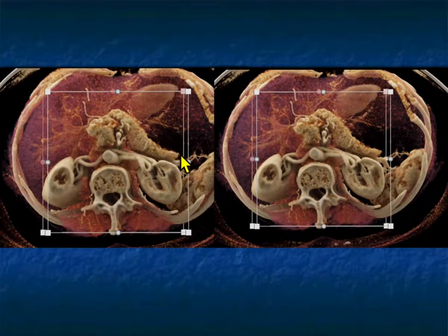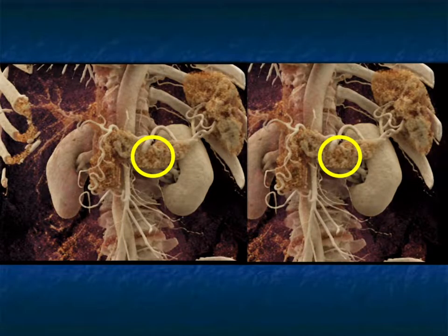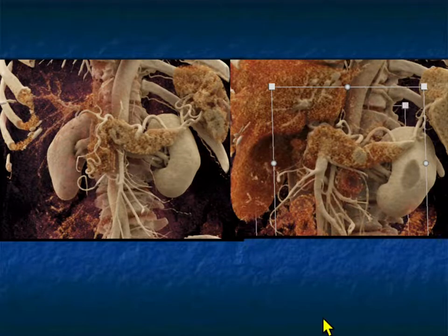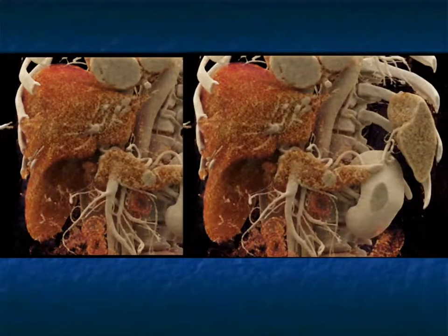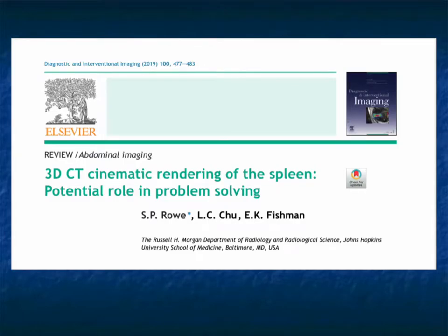At first glance, the pancreas on arterial phase looks pretty good, but then if you look a little bit more carefully, you see the textural change. And this is a good example of a case where the lesion is obvious on the cinematic, but was not seen even in retrospect on the arterial phase imaging. The textural changes are accentuated by this technique. And again, here is the arterial and here's the venous. Yes, even here it shows better on the venous than on the arterial, but you see them with both techniques very, very nicely. Okay, a really nice example of showing you that. Pancreas really well defined with the neuroendocrine tumor.